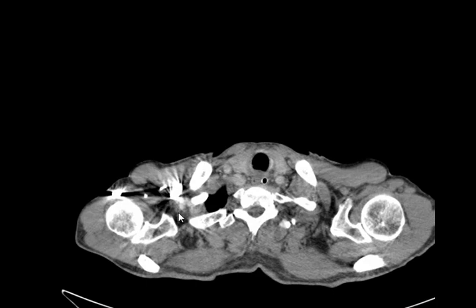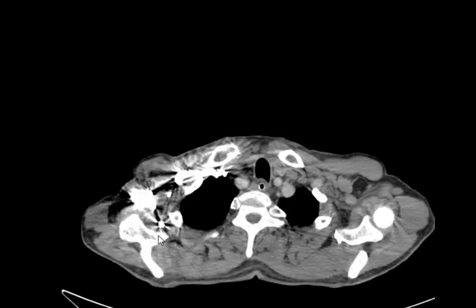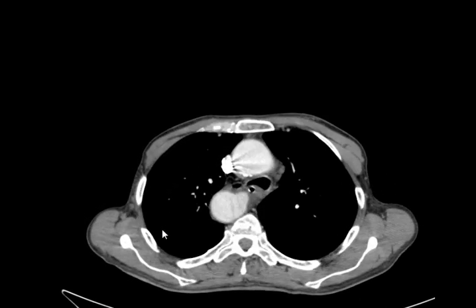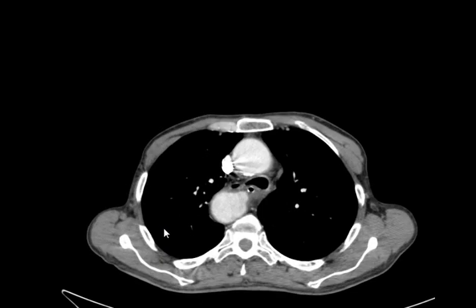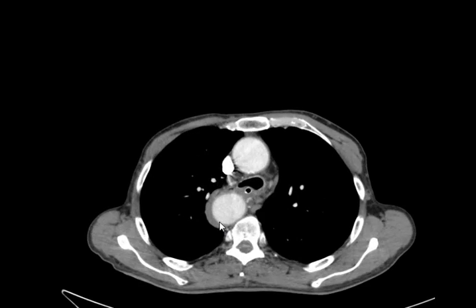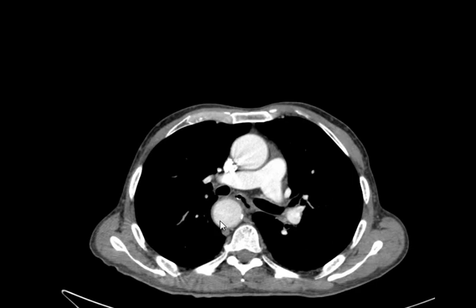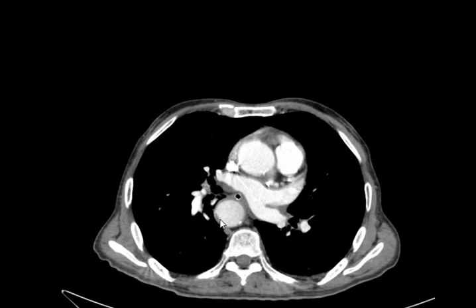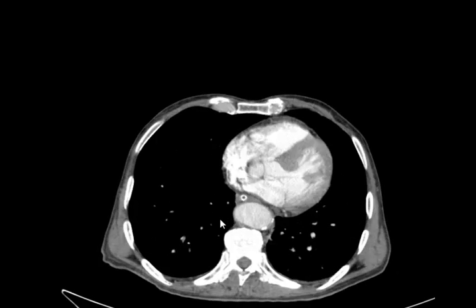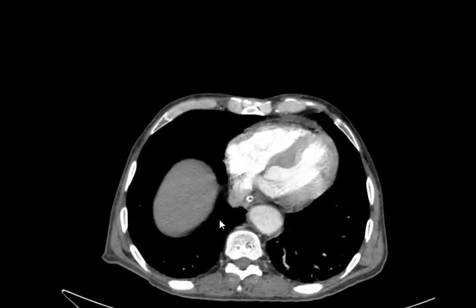But really, the man is tired. He has had the aortic arch from birth, so why is he tired now? Do you think this is a collection? This is the azygos, an azygos crossing, because the right-sided aortic arch appears this way. Good. Where else?